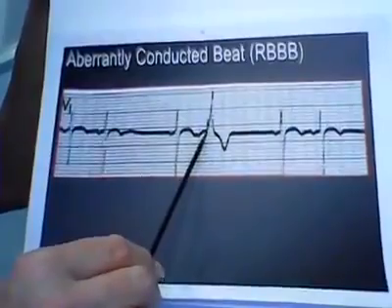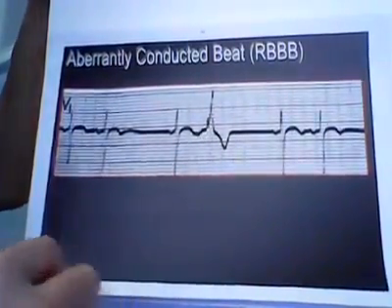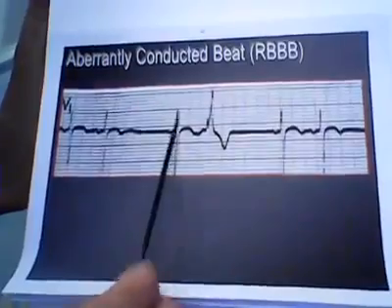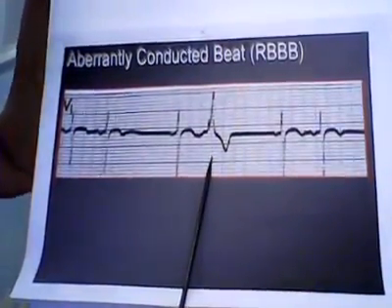How do I know? We have little mountain. You have little mountain, you have little problem. This is that atrial bigeminy again. Atrial bigeminy: normal beat, PAC, normal beat, PAC, that got aberrantly conducted because the right bundle was tired.